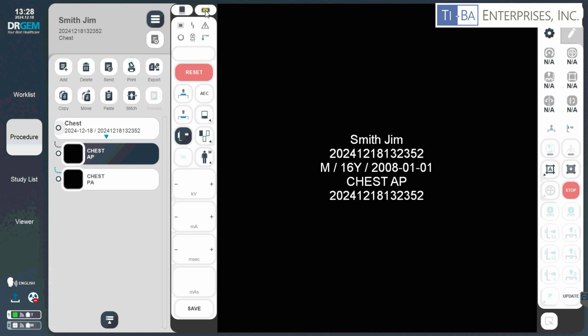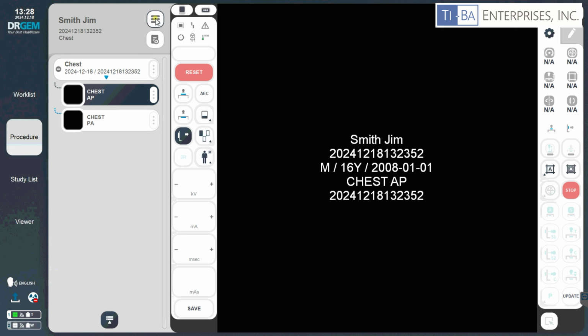So it can come and go depending on what you like. Over here we've got some different tools that would be used after the study. Maybe they would and maybe they wouldn't. And if you don't want to see those, you can click on those. That little menu item right there sort of cleans up the look of this screen for you.